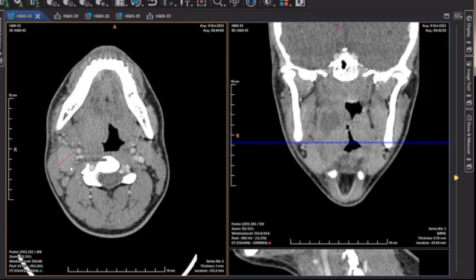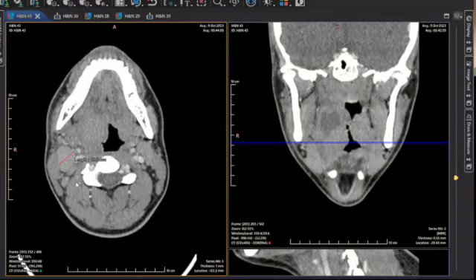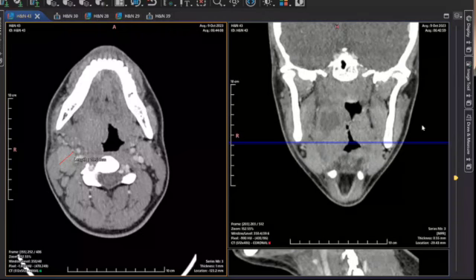If it's a fairly young patient and it's obviously infection, then I'd just call these reactive lymph nodes, even though they're fairly chunky. But if it was an older patient and I was feeling a bit more cautious, I might say it'd be good to do an ultrasound after the acute admission has resolved to make sure the nodes go away. But this is a young patient, and these are just some very chunky reactive lymph nodes. So that's a nice peritonsillar abscess.